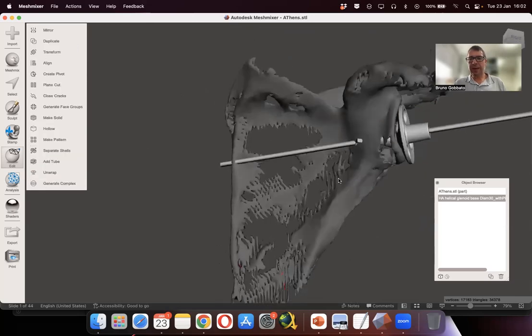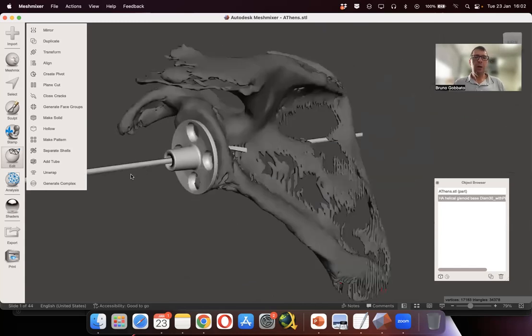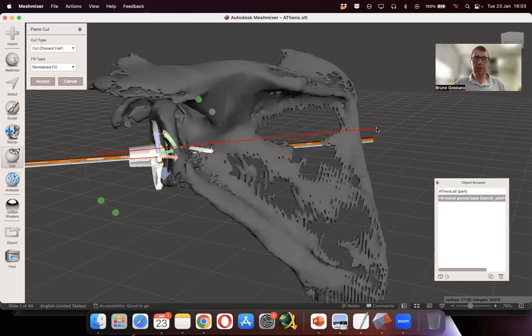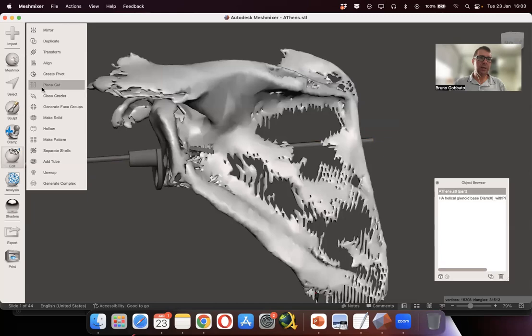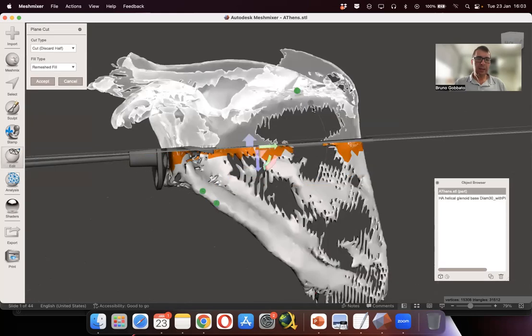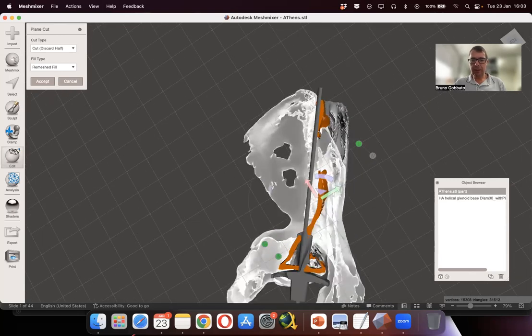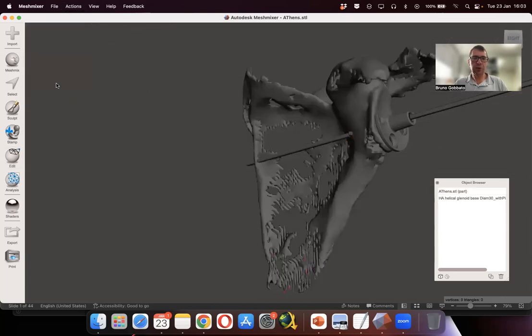So this would be the best position for this implant. The patient would have a very big implant. We can check how is the vault, doing a plane cut, just like that, with the glenoid. Let's select the glenoid, edit, plane cut. Let's cut over here. And that would be how the implant will be in the vault. It's in the center of the vault, which is good, but it's a big implant for this patient. So I would not go for that implant for sure.